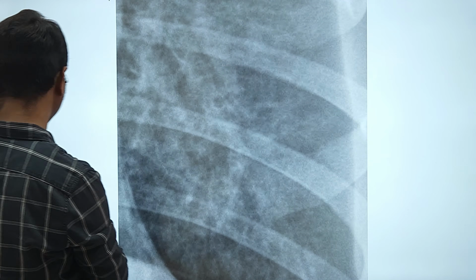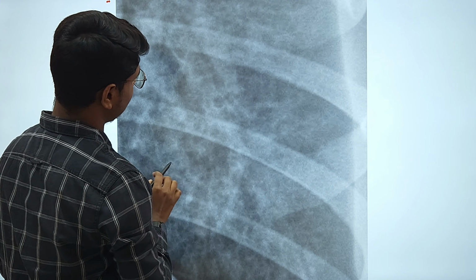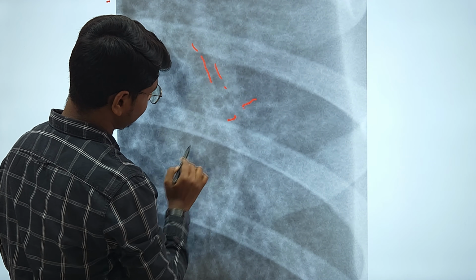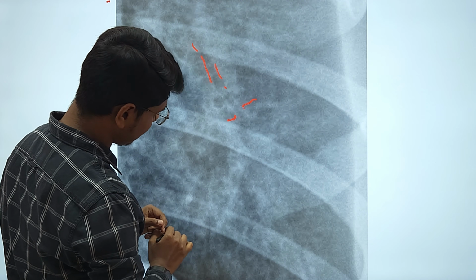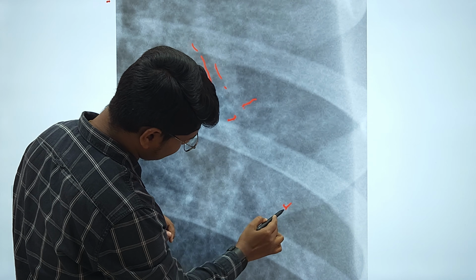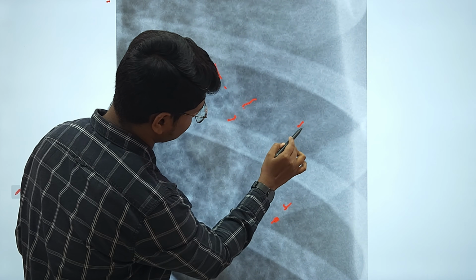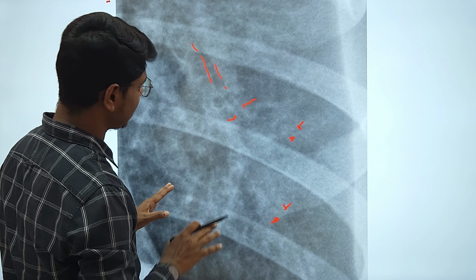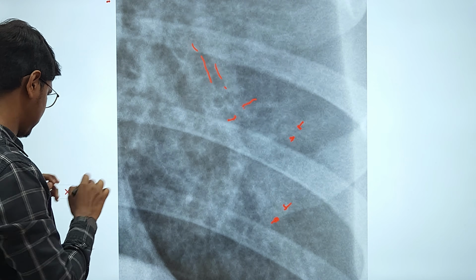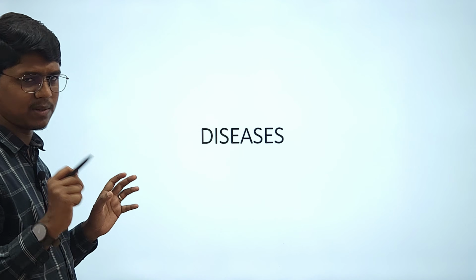This is another one. This is also unstructured, but you can see a bronchogram here. This one is a tram line. There are other tram lines also. This here is slightly visible. So this one is the mixed one. Here is another tram line. So this one is also mixed. When they are mixed, go for other signs and symptoms, or lastly you can go for lung sampling.